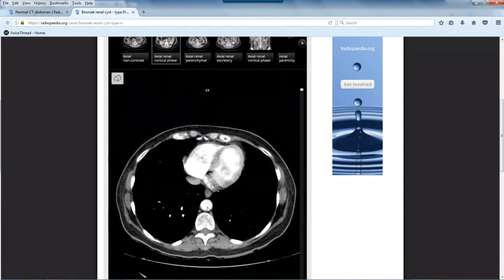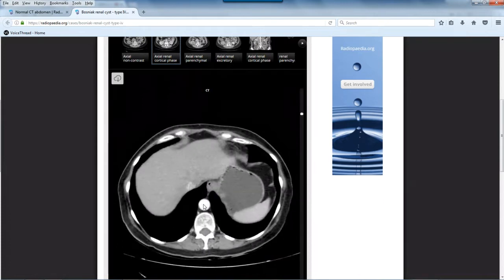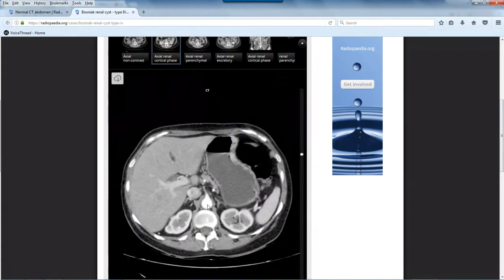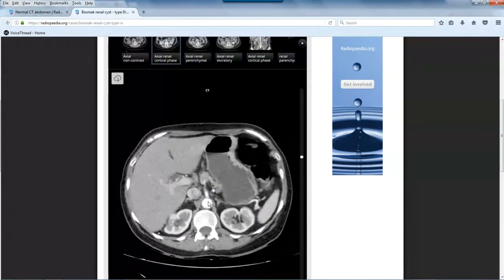See how the aorta is nice milky white? It's a bright milky white. That means we are in the arterial phase of the aorta. So the contrast is mostly flowing in the arteries of the circulatory system. So here's our aorta. We're going to follow the aorta down, down, down, down. And the first branch that's going to come off anteriorly is your celiac axis or your celiac trunk.